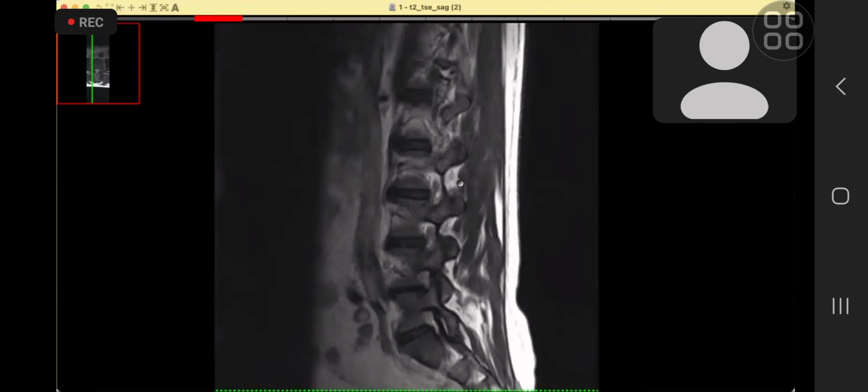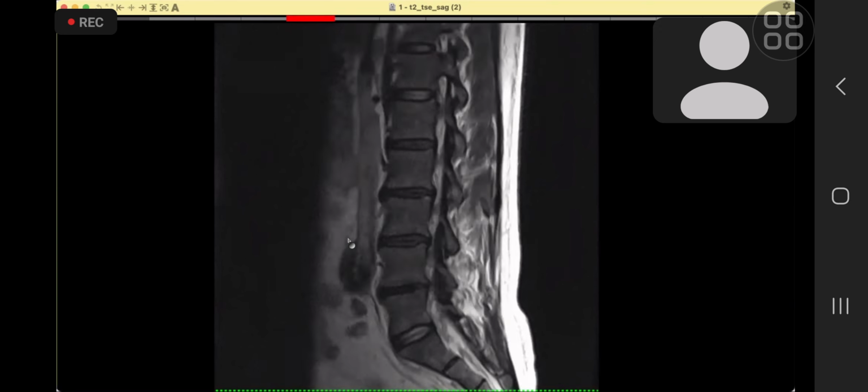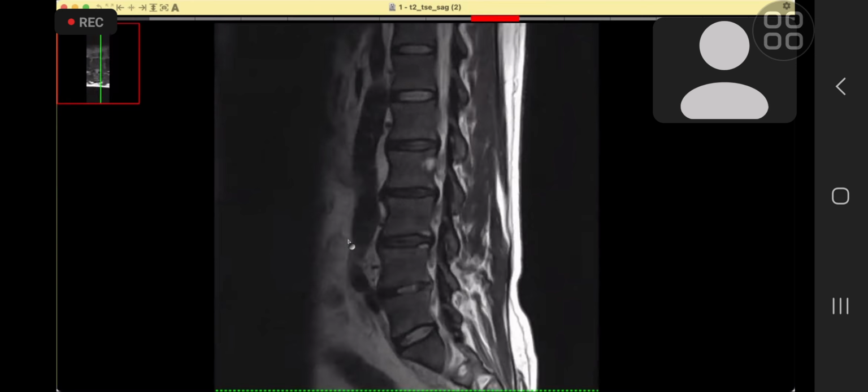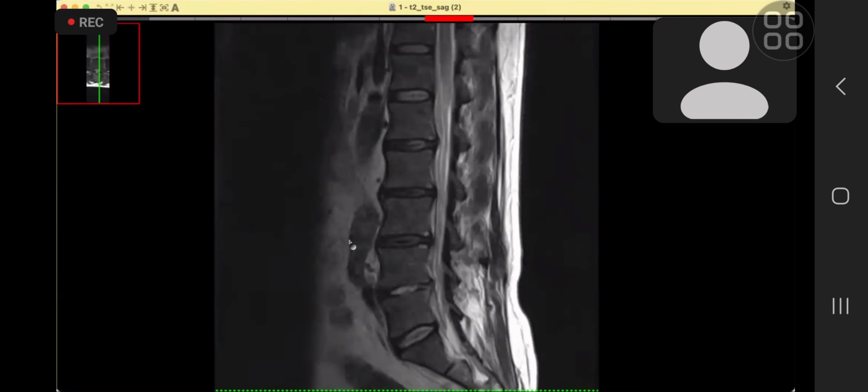I'm going all the way to the parasagittal plane on the foramen. The keyhole here, fat is preserved except for the L4, L5. It's obliterated on the, I'll check if this is the right or left side on the synchronous image of the axial scan. I'm going the other way. The keyhole here is normal.